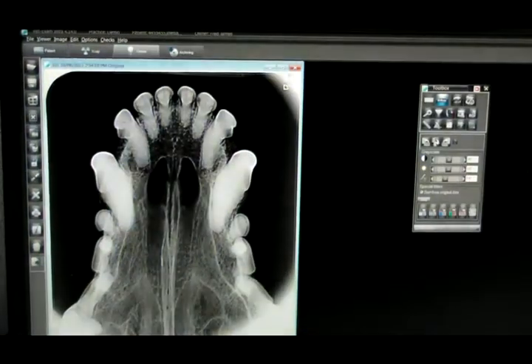It opens up in Viewer and shows you the two X-rays. To open one X-ray, just double click and that opens that one X-ray on the screen at full size. To close, just press the red cross. To open up the Viewer box again to see what X-rays you've got, just click here. To open up multiple, hold the Control key down on the keyboard, left click, this gets two images up, left click and hold on your mouse, holding all three down at the same time, left go, and drop them all at the same time as well. Then you'll have two images open up on the screen together.